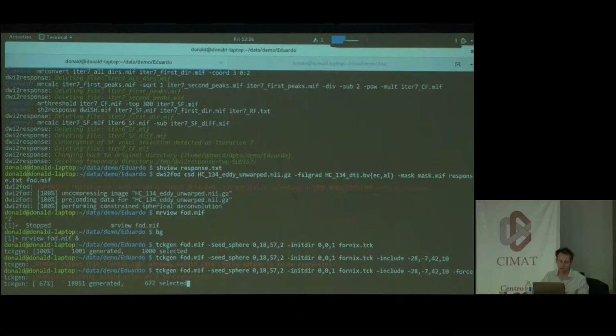But we've talked about doing it in this version. So when you force a file that is already loaded, it's essentially left one on RAM, so you have to kill it and then start again. This is on the issue tracker. It's one of those things that we'd like to fix eventually, but we haven't got the time really, basically.